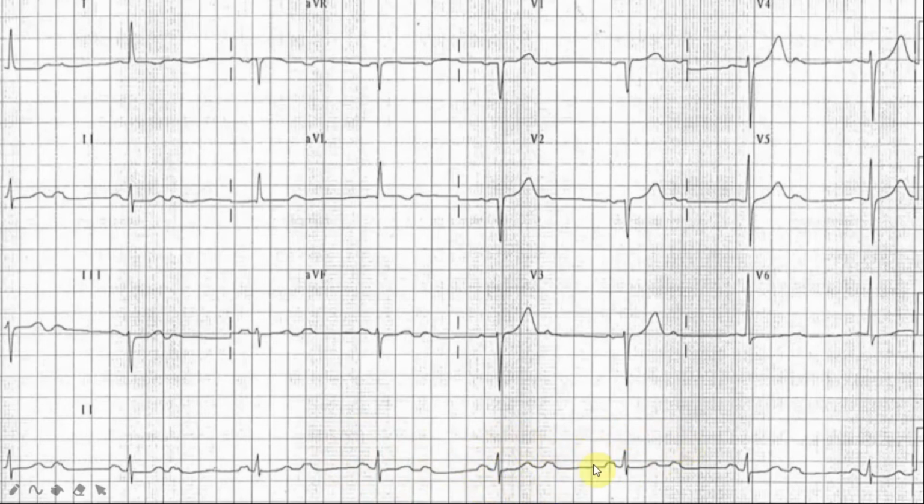It can be quite challenging to say whether this is Mobitz type 1 or Mobitz type 2 simply by looking at the ECG. An electrophysiology study may be useful to come to a conclusion. Now, the QRS complexes are narrow complex and regular. The ST segments are isoelectric. The T waves are normal. The QTc is about 400 milliseconds, which is normal. The aVR lead looks reassuring to me.